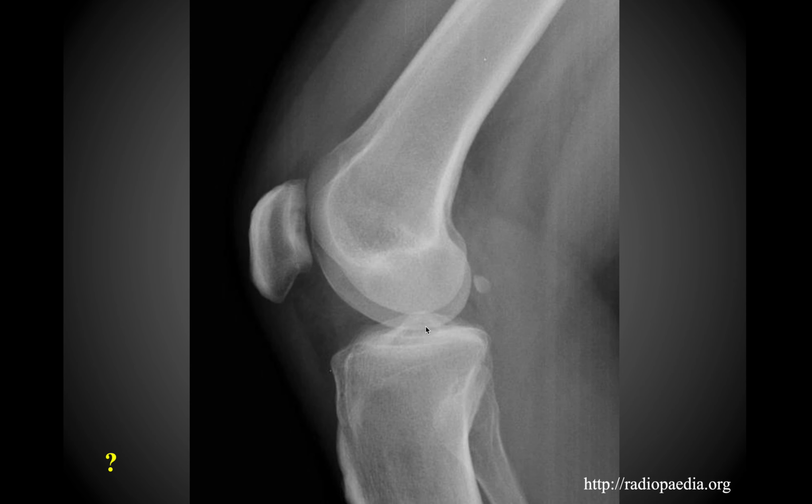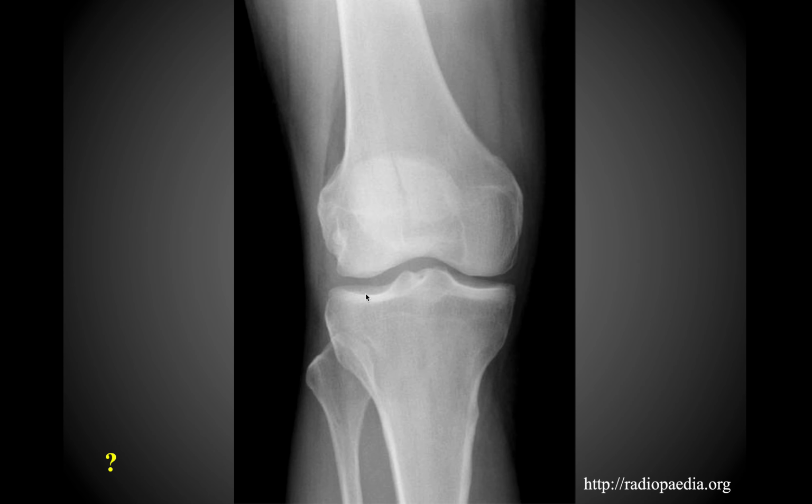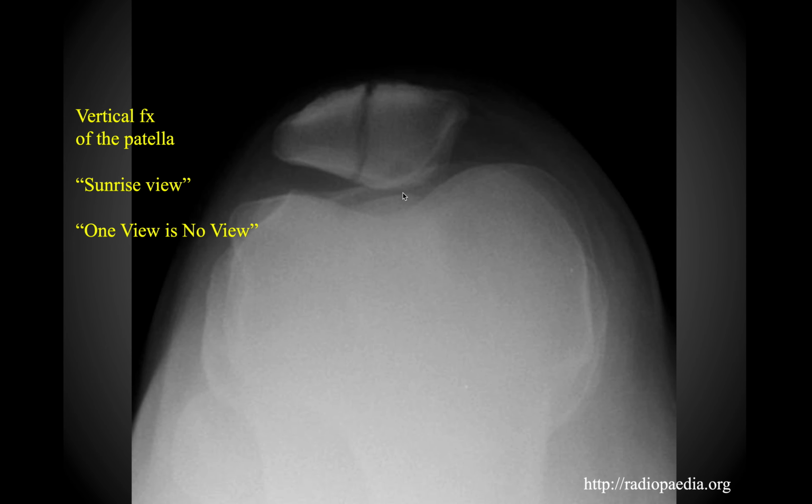Here we have another lateral view of the knee. And if you look closely on this view, this is from the same patient, you'll notice with the patella there's this central defect in the patella. And so sure enough, looking at what's known as the sunrise view, this is what we call a vertical fracture of the patella, going right down the midpoint of the patella, basically breaking the patella in half left to right.